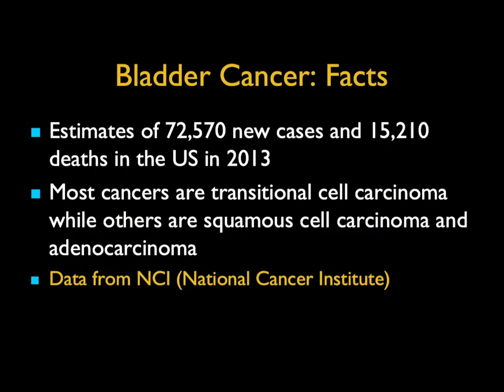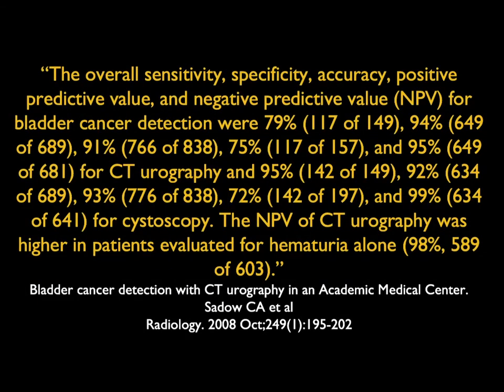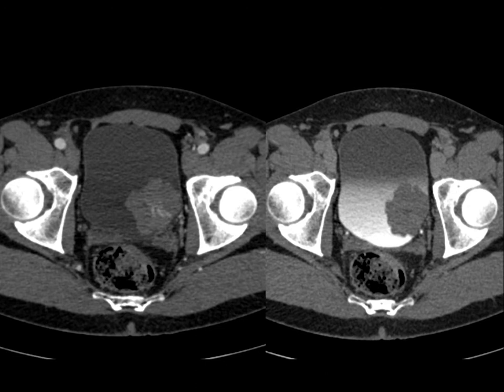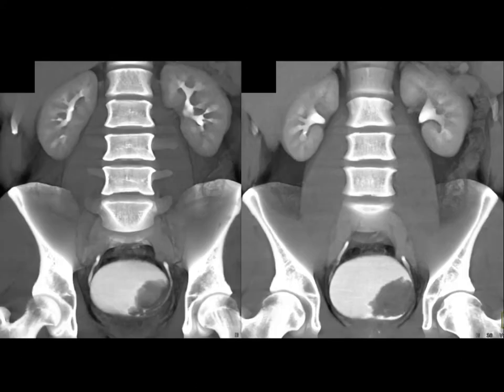Now, beyond the kidney, when you have hematuria, you've got to look at the bladder. I'm not talking about bladder tumors when we do staging, but often bladder cancers can be small when they present. CT is highly accurate for detection of bladder cancer. Here's a good example, a large mass, over 3 centimeters, posterior left side of the bladder. It's solid. There's some enhancement. There it is early and there it is late. No problem, bladder cancer. And then you look at the coronal views, you can see the extent, that it comes near but does not yet involve the patient's left ureter, a very good appearance.